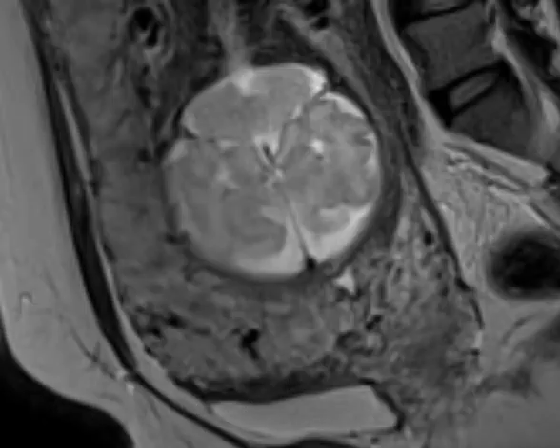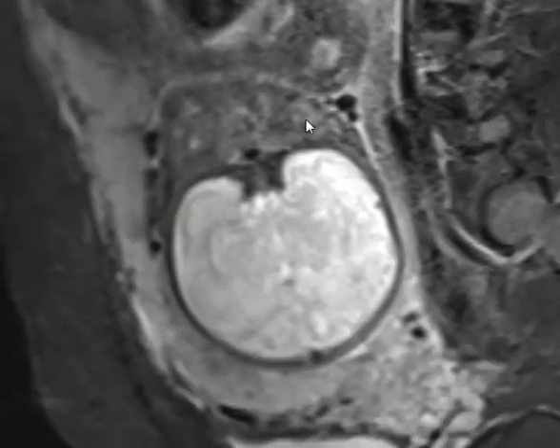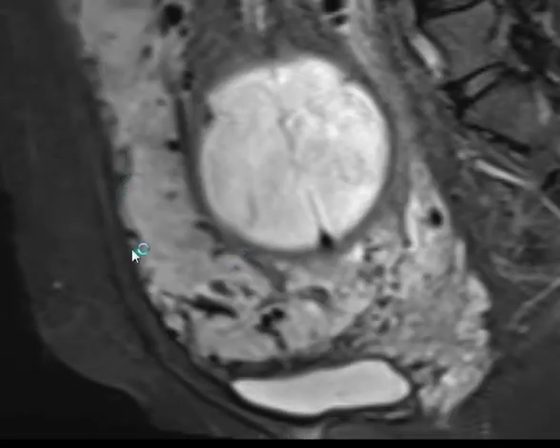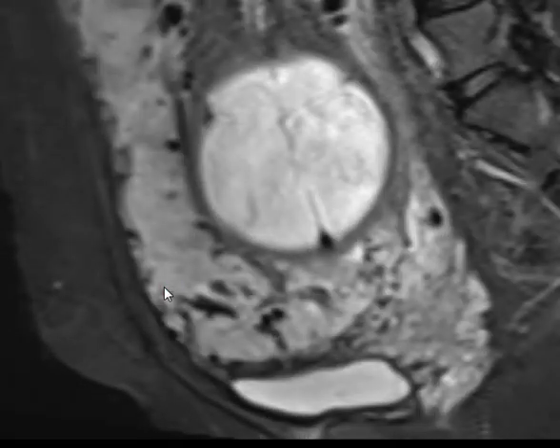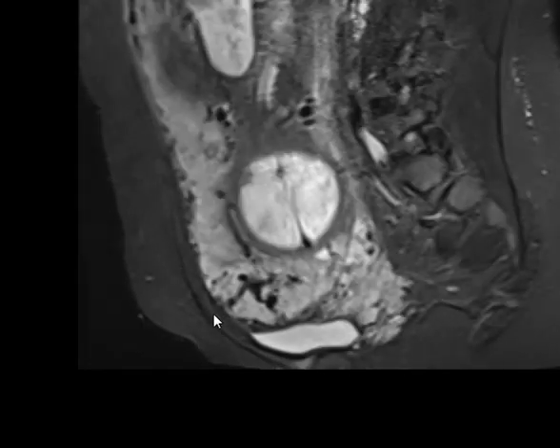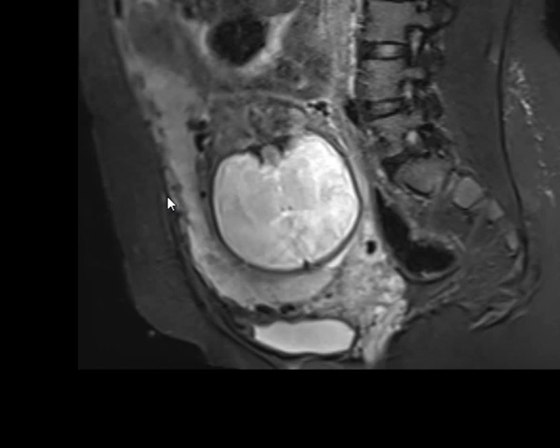And let's go to the T2 fat sat. Of course, there is a motion artifact, I know. But however, the placenta is well seen and you don't see any distinct myometrium here, right? What about the vascularity? Increased, there are a lot of flow voids, more than normal. And the shape of the placenta? The edges are rounded and bulky.